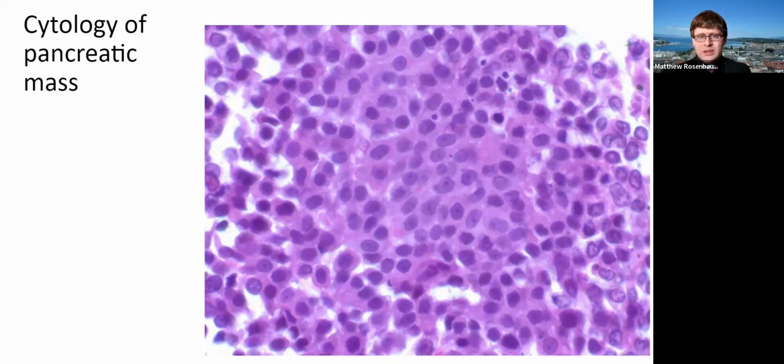They're a little bit homogeneous. You can see thick, almost eosinophilic cytoplasm. They have large, relatively monotonous looking nucleoli as well, and a relatively high N/C ratio. This isn't 100% specific on cytology, but the fact that you have this relatively dense cytoplasm, quite a bit of it, and these distinctive monotonous but atypical looking nucleoli is highly suggestive of an acinar lesion.